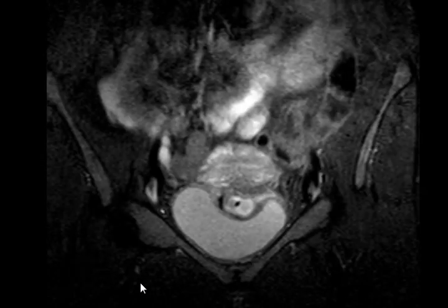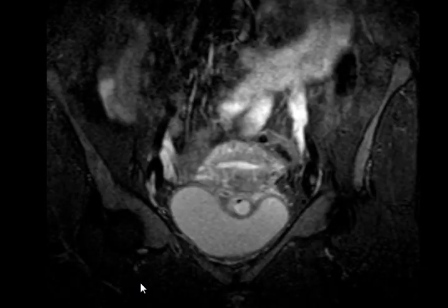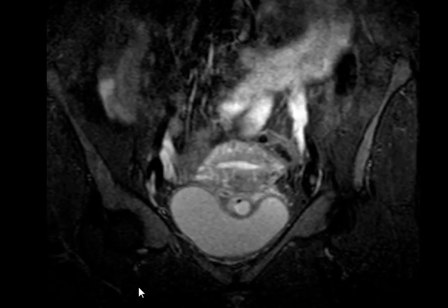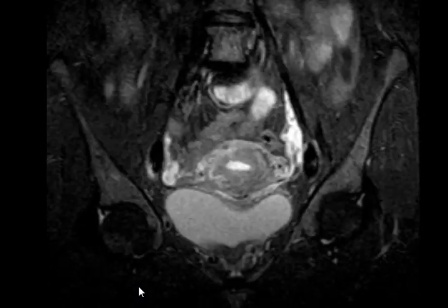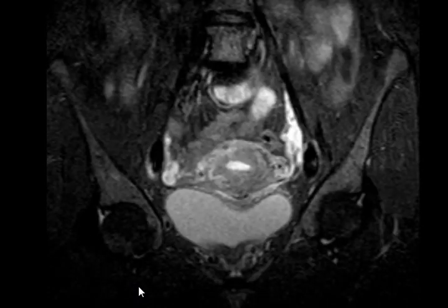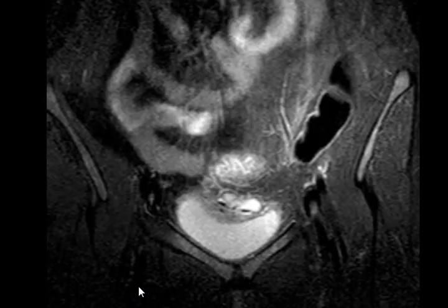Okay, I have one case, I showed it several years ago. An IUCD that is dislodged from the uterus and is now intravesical. How? God knows. How it went from the uterus into the bladder, nobody knows. Okay, it's not that hard, but it needs some attention.